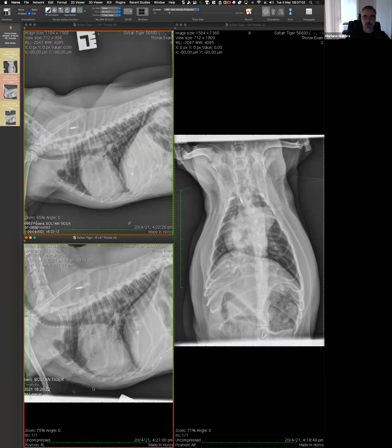Okay, findings: normal, abnormal. Very abnormal. Okay, yes. Now there's an area of calcification. Okay, yeah. There. Yeah. You can see it here as well, almost, yeah, there.